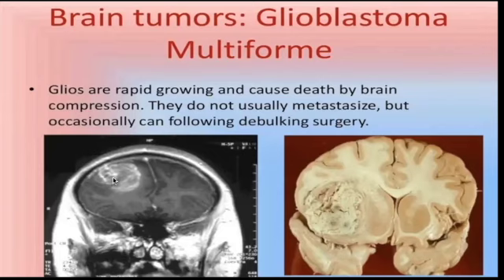Now, as I said, it's very inhomogeneous, and if you look at this image here, it has a necrotic core on the pathology. This necrotic core should appear more hypo-intense on these images, and hypo-intense means that it should appear darker, while the peripheries should appear more hyper-intense, or whiter.